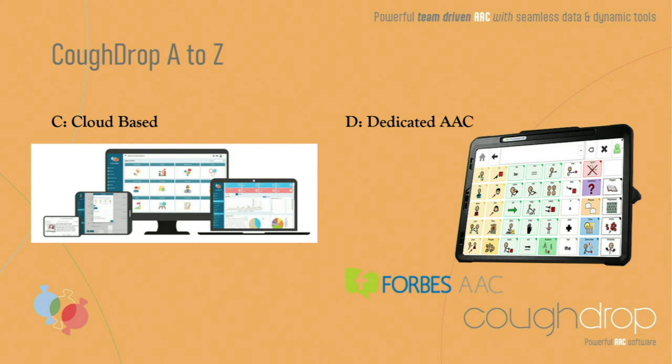The answer is no. CoughDrop will run regardless if you're on Wi-Fi or not, but if you do make edits and you need to do a sync, that does require Wi-Fi. So frequently we recommend, if you know there's been changes or anything has been updated, do a quick sync and then you can go about your day and you don't need to touch the cloud again.